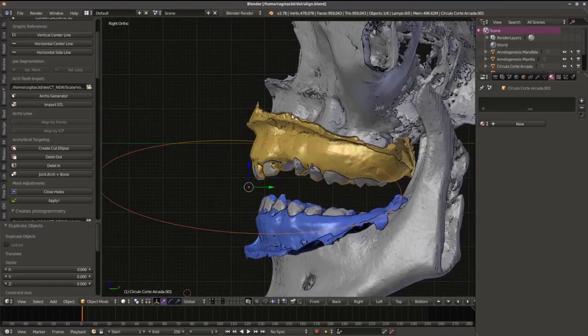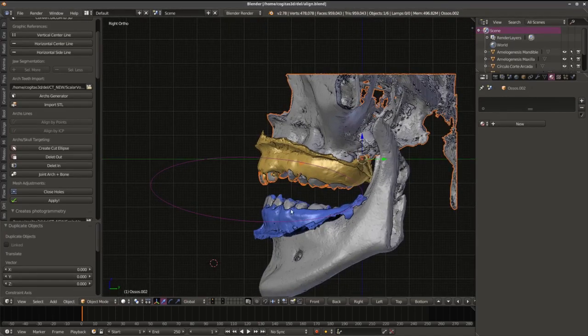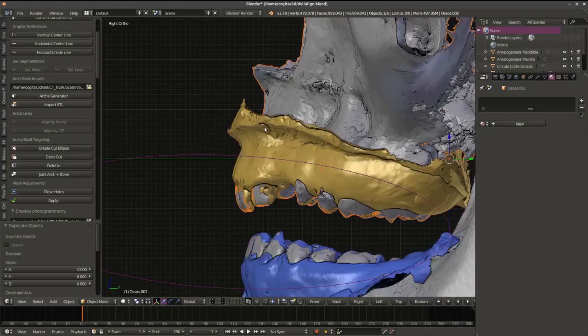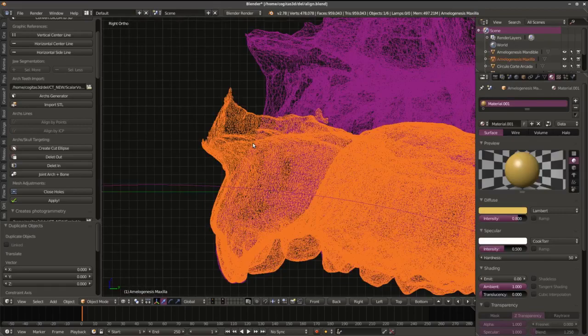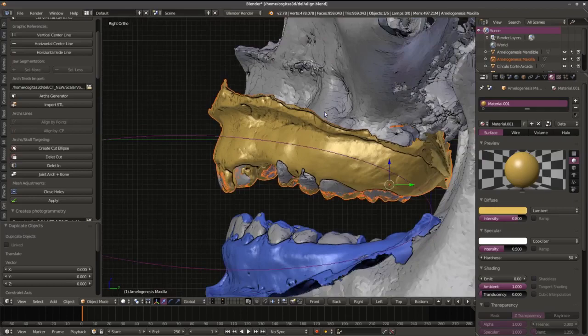Now what I will do, I will copy here to have a copy, and now I will do two things. The first thing is, let me see the size. Look, we have a great number of subdivisions. We have a lot of faces, almost 1 million, and I will decrease the value of these faces. I think this value is good. The problem is this value. Maybe it lags a little.